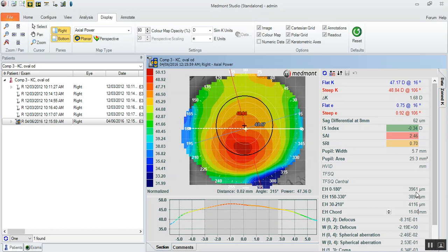So this can be a manner that you can choose your initial Ampleye scleral lens very fast and efficiently. Simply take your composite map, go to your estimated height attributes, set the chord appropriate for the Ampleye diameter you're going to use, and assess one or all three and average these sagittal depths out, and then add in the fluid layer. Remember, 250 to 400 microns of fluid layer on application of the lens. That's what we're targeting. So that's one of the methods that we can use.